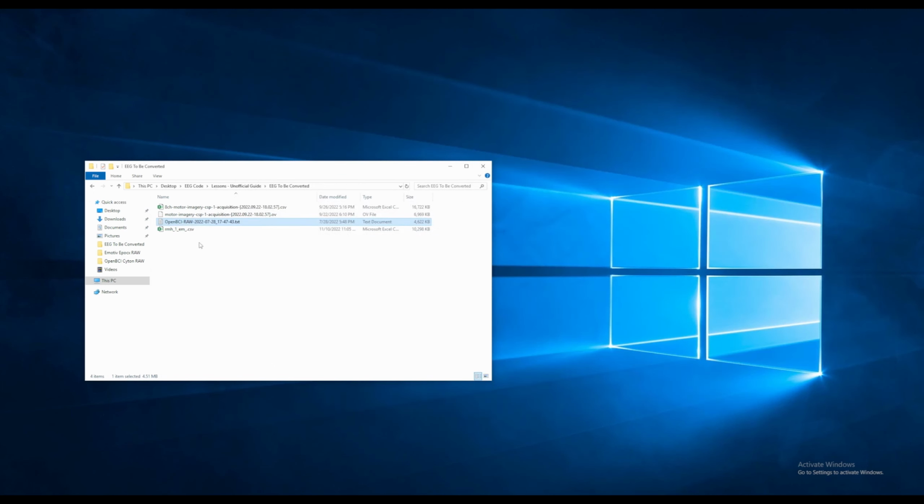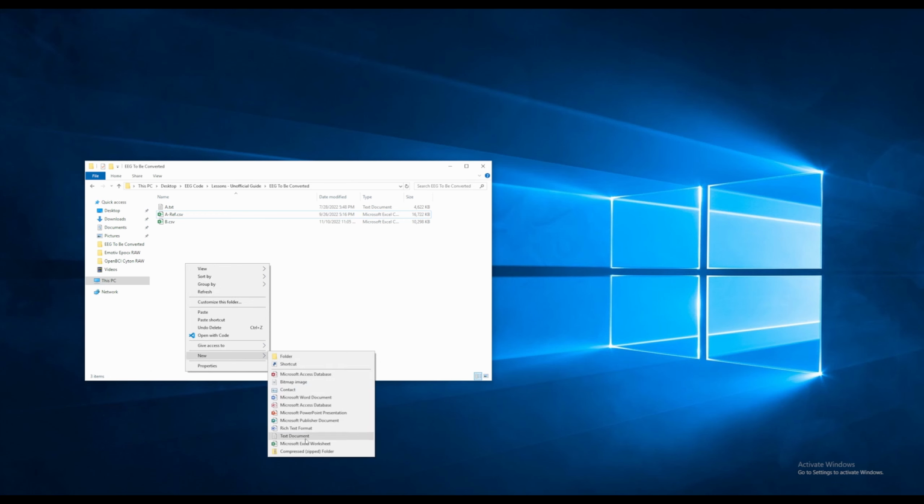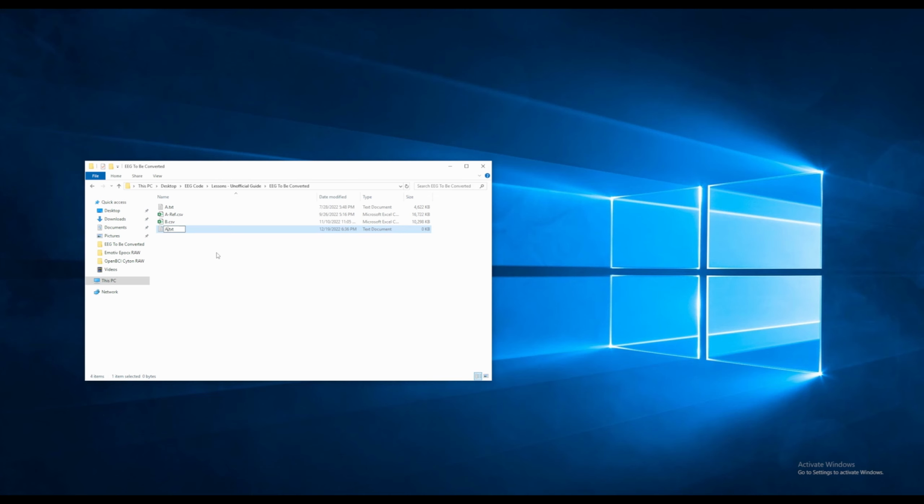Well, let's just rename them so we can tell them apart easier. And we're going to name the OpenBCI one A and its reference AREF, and the one from Epoc X we'll call B. And this is the OV OpenVibe file that we don't need. So we're going to take the signal from A and use AREF as a reference and create a new file. Let's call it A converted. And it could be .txt or .csv. I'll just choose .csv for it.